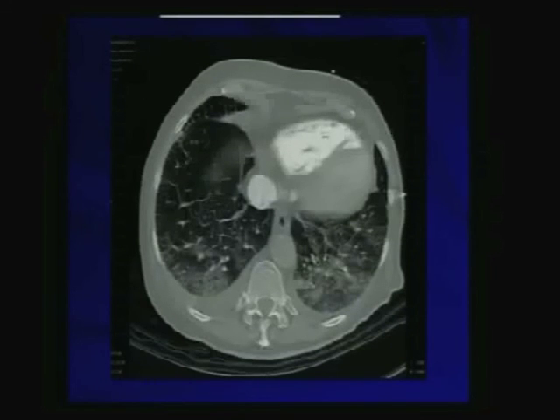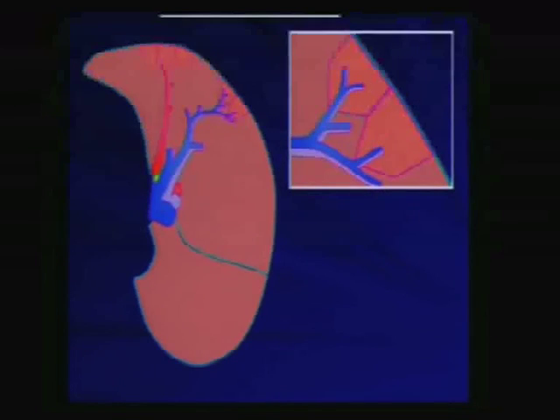This is an example of pulmonary edema that has gone from interstitial to alveolar disease. We don't do a CAT scan for pulmonary edema, but again, for pattern recognition's sake, this is how we recognize it, and that's how we contrast airspace disease from interstitial lung disease.